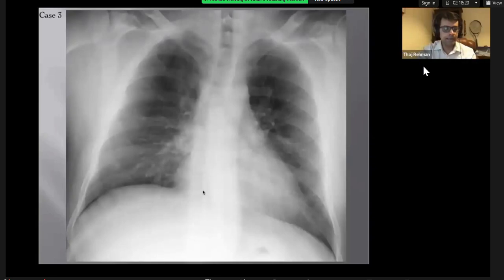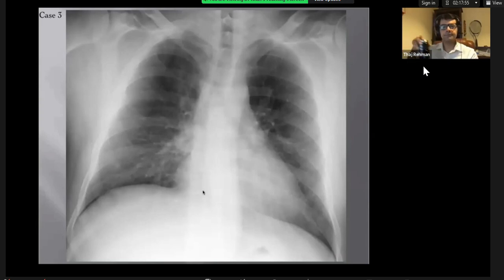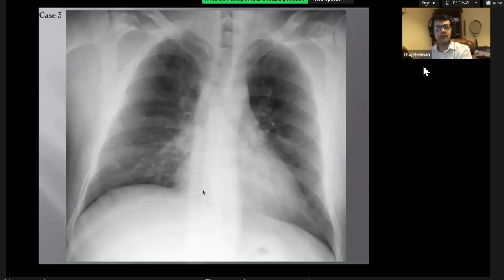Okay, case 3 for you, candidate number 1. So a PA chest radiograph for an adult patient, slightly rotated. There's an abnormality in the region of the right hilum where there's an increased density by a rounded, somewhat lobulated soft tissue mass. There's no widening of the mediastinum. Yeah, fantastic. That's brilliant. That's all. Rest of the X-ray is fine.